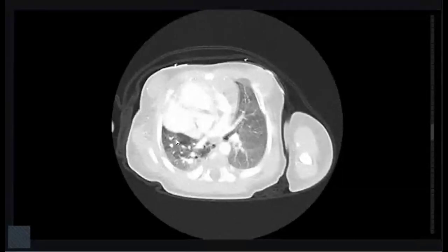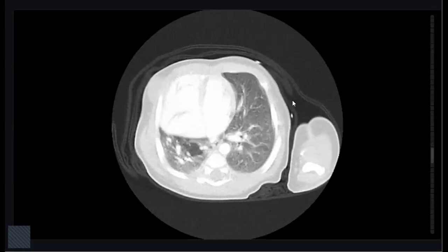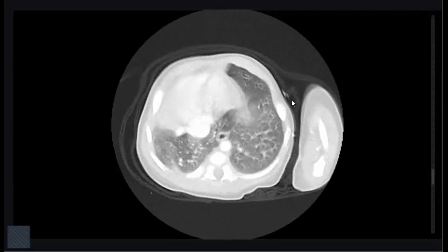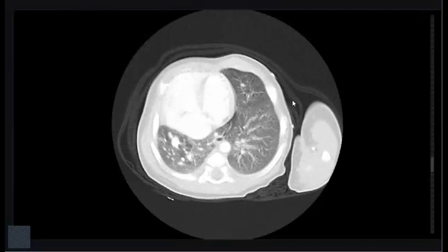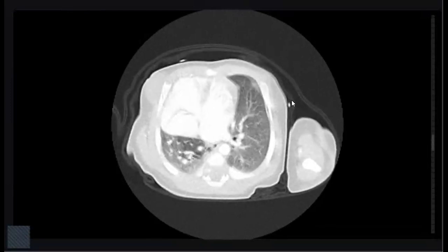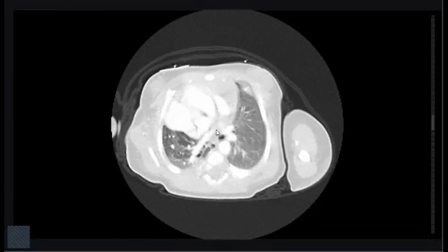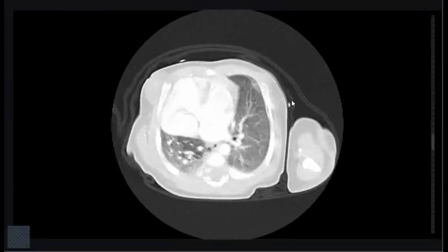On the lung window, the findings are not typical of congenital lobar emphysema. Rather, I think there is a hypoplastic right lung with mediastinal shift toward the right side, and there is hyperinflation of the left lung. So these findings are likely congenital in origin, due to pulmonary hypoplasia. No evidence of congenital lobar emphysema.